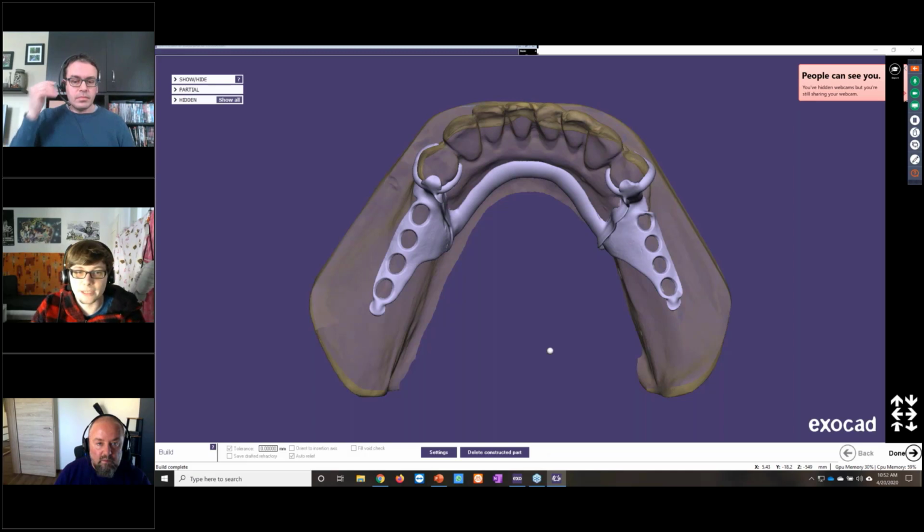Yes, I've been told that you can actually go as high as 0.1, which for me felt really big, but still in the printing process, if you cast it afterwards, it seems to make no real difference. But this is something you will have to try out yourself with your own printers to see if there's a difference. In the end, I did a couple of tests in the past, and I found out that the value of 0.025 was a good compromise between having a good quality and a not so big file.